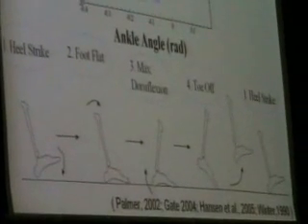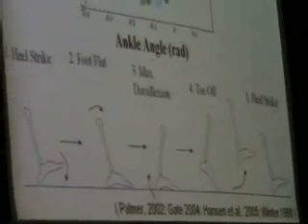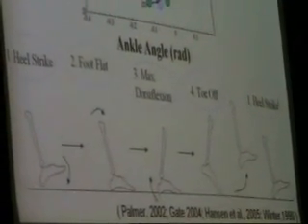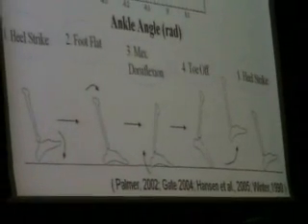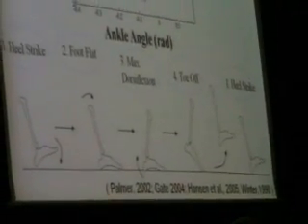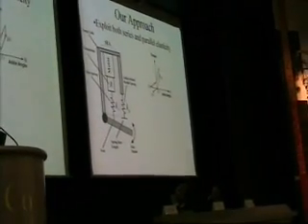So this is ankle torque versus ankle angle from a normal, healthy biological ankle, and the robotic ankle is mimicking this trajectory. We do that with this robotic architecture. The ankle has a motor and a transmission with a series spring.